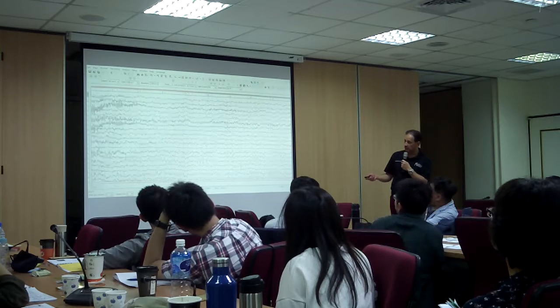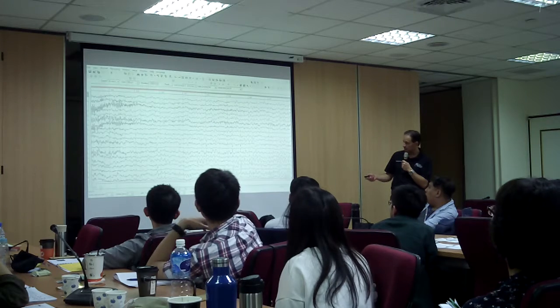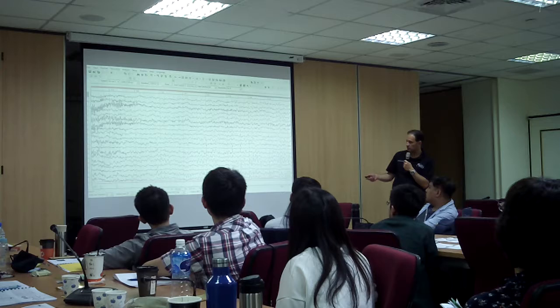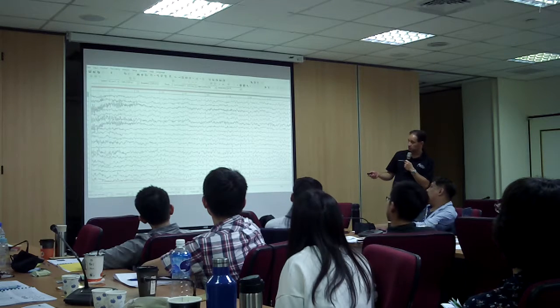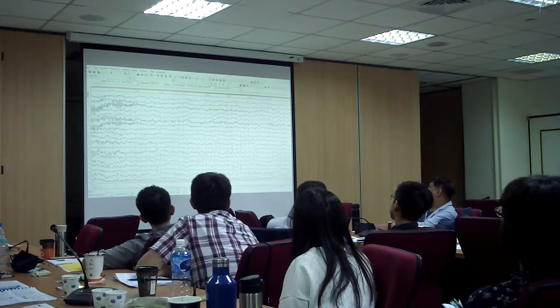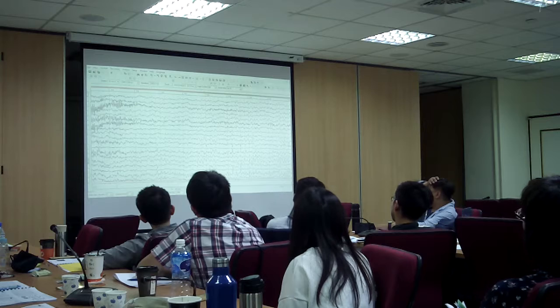For instance, look at that right there. What's that? Slow, fast? This right here. That's slow, right? What's that right there? Slow or fast? That's slow. Very good. So let's see where it is and what range it is. I want you to tell me what type of activity that is. So this is PZ.